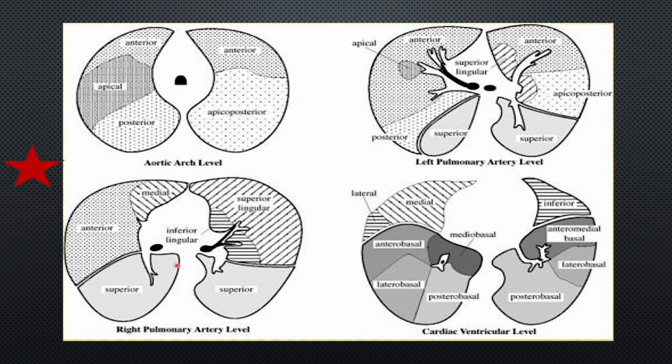When you are looking at the CT scan, for a pulmonologist, a clinician, an internal medicine physician who's not a radiologist, I think we should stick to some basic landmarks that help us understand better. So for that, 4 landmarks are the best to understand the CT segments.